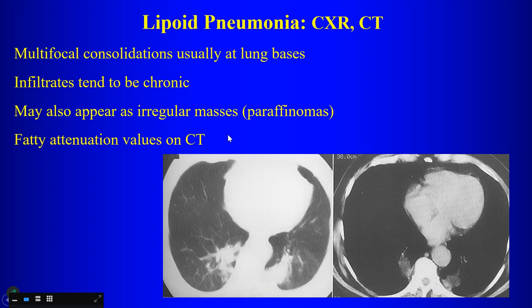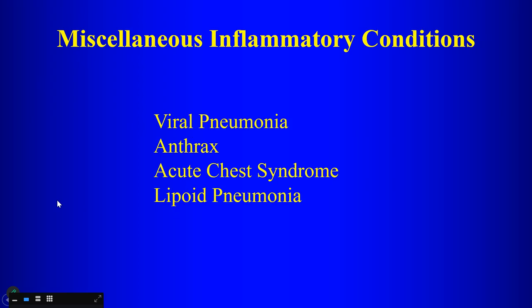Okay. So consolidations on lung windows, but fatty attenuation when you look at the soft tissue windows. So that's important for making the diagnosis.